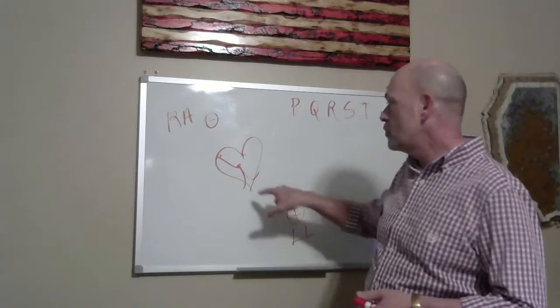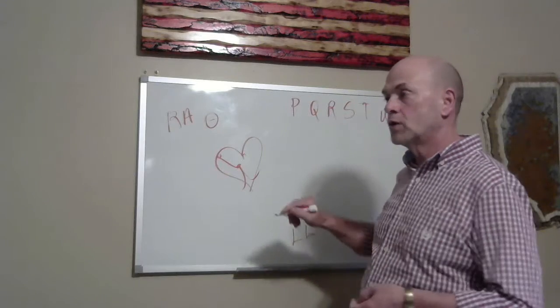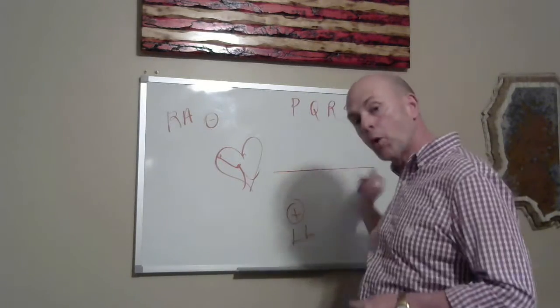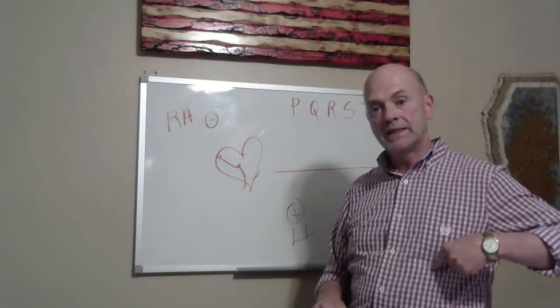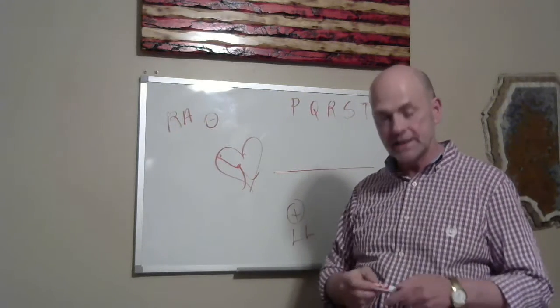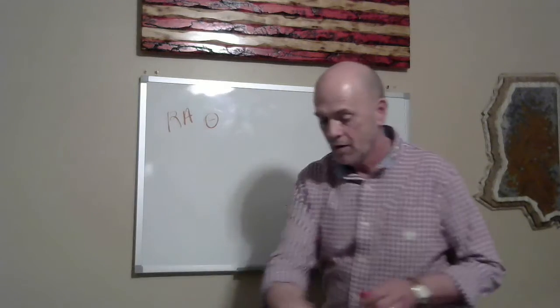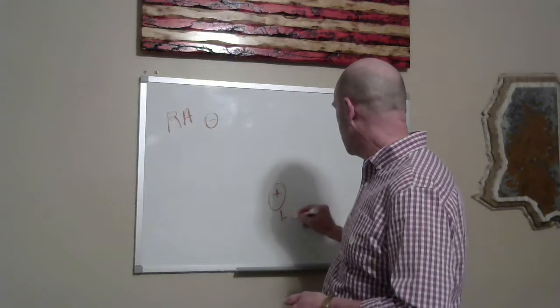As we move toward a positive electrode, we will see electrical tracings that move above an isoelectric line. We know what the flat line is. Everybody knows that's asystole. There is no electrical energy being developed. There's no automaticity, no depolarization or repolarization when we see the isoelectric line. What we do see when there is depolarization and movement of electrical energy in the heart is tracked by the left leg lead.